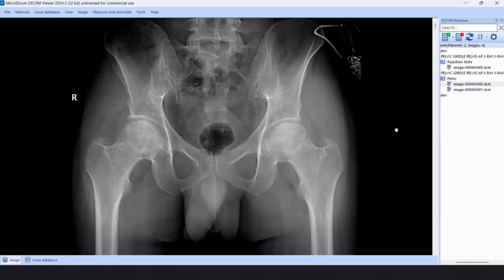Grade 4, if we have secondary osteoarthritic changes. So we don't have secondary osteoarthritic changes. Do you agree with me? Okay. So in any case of femoral head avascular necrosis, you should comment on the complications. You got the abnormality, but you didn't mention the complications. We don't have secondary osteoarthritic changes, so you should enumerate the complications.